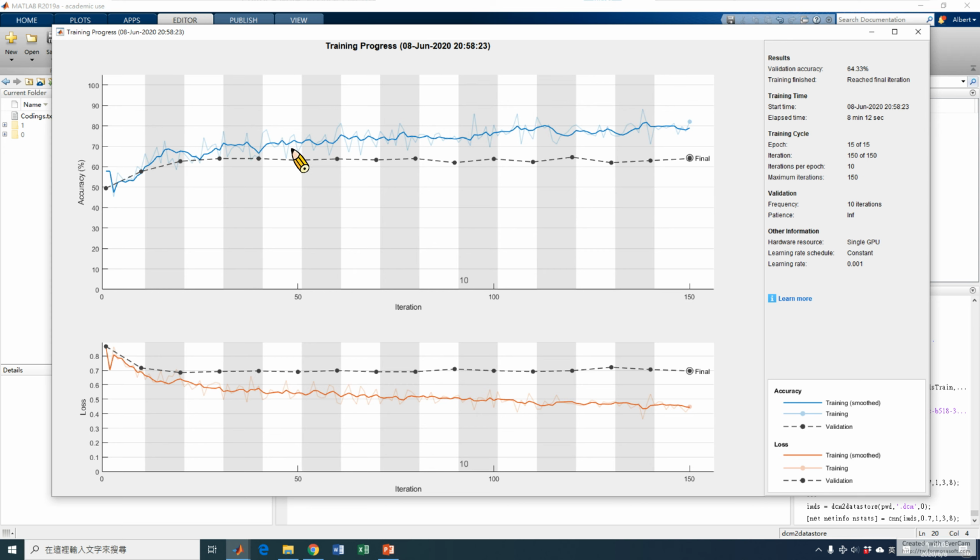But anyway, this is just showing how we use a simple CNN model to do pneumonia classification. It is more difficult than the pathology image analysis, and so maybe we need more sophisticated deep learning models using transfer learning.